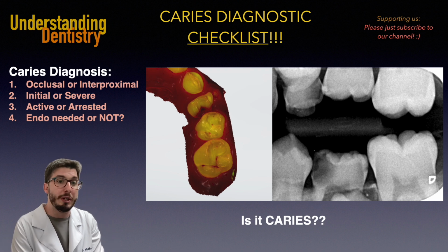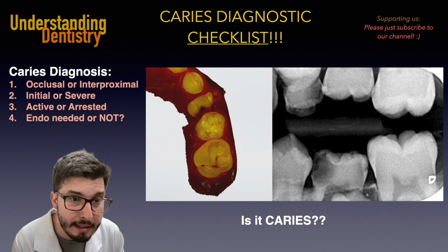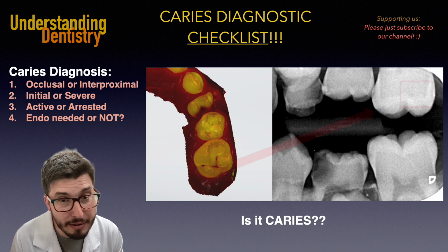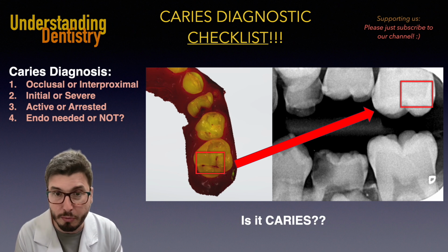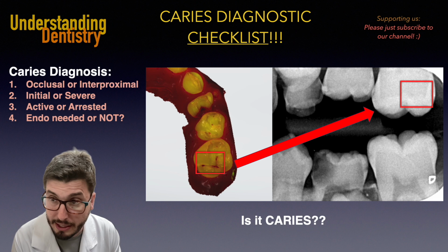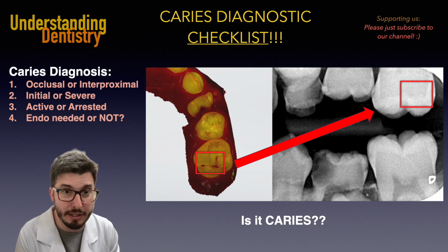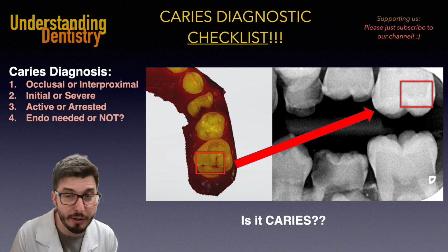Now let's see what's going on here. We have this upper teeth first, and again we have the fissures stained, but is this caries? Well, we need to check the clinical examination to make sure that this is caries, okay? Otherwise, by the radiographs, you cannot consider caries for sure, all right? So that's something really important for you guys to learn.